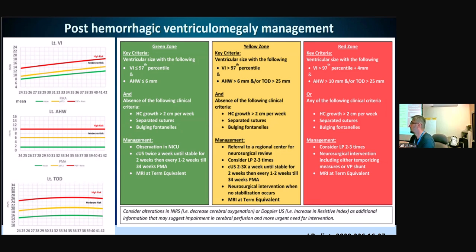So if there was a grade 1, but it worsened, then you just say significant worsening. Yeah, from 1 to grade 4, say significant worsening. So initially there was no hemorrhage within the ventricle. It was subependymal. Now I see intraventricular hemorrhage. So they need to follow up, because you may have post-hemorrhagic ventricular dilatation now, and you may have some neuronal loss.